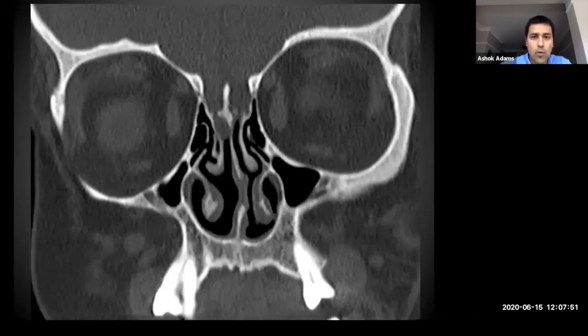So one of the other check areas when you're looking at that frontal area and the anterior skull base is always to look at this olfactory niche. So it should be nicely aerated. So in terms of the anatomy, there's the crista galli, you've got the cribriform plate, the lateral lamella, and here you can see the top aspect of that nasal septum. You've got the turbinate there, and you have this olfactory recess or niche that should be nicely aerated. And you can see little defects here. That's where the olfactory nerves will run through.